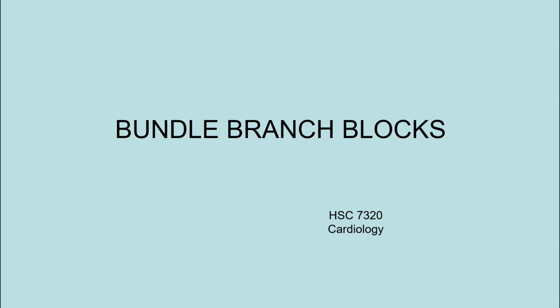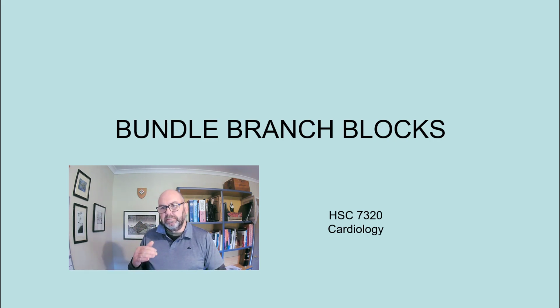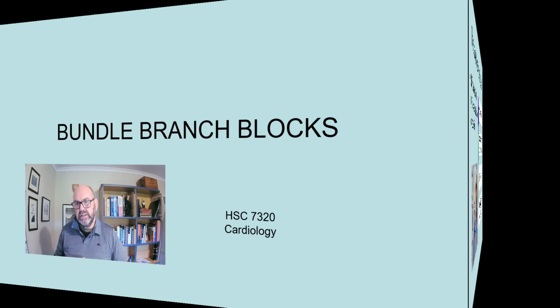This session reviews the ECG characteristics of a bundle branch block. They can interfere with the aspects of ECG interpretation and specifically with that of ST segment elevation. They're likely to produce a STEMI mimic, and recognising the block may prevent undue concern for all involved and unnecessary treatment or cath lab activation.